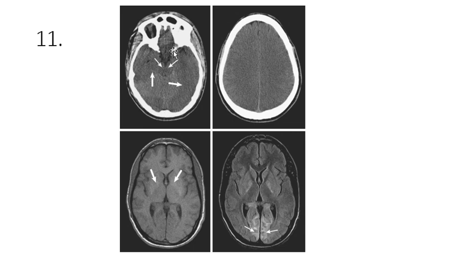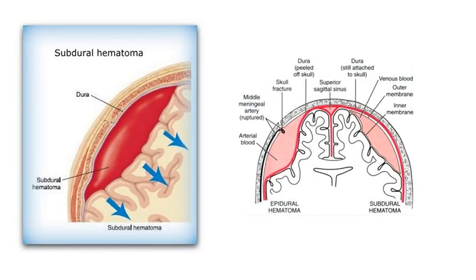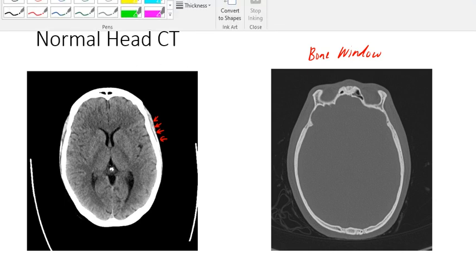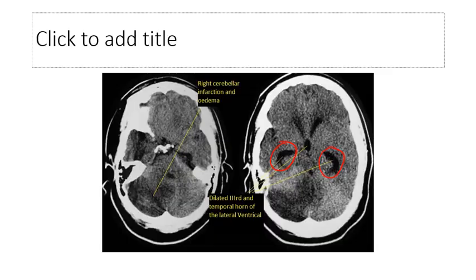Okay, and the second last thing that I'll add here, are you seeing this brain CT? What are you seeing here? You see a normal head CT, you're supposed to see, let me just show you here. You can see nice demarcation. You can see the white area and the gray matter. So you see the white and gray matter differentiation. You can clearly see it demarcated. Now, what are you seeing in this head CT?